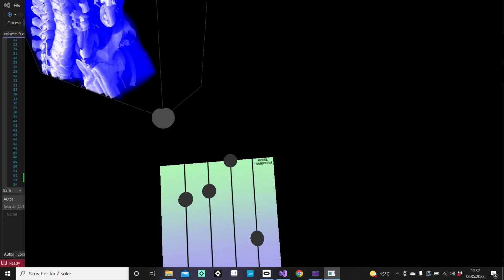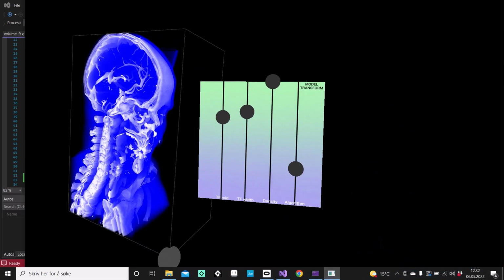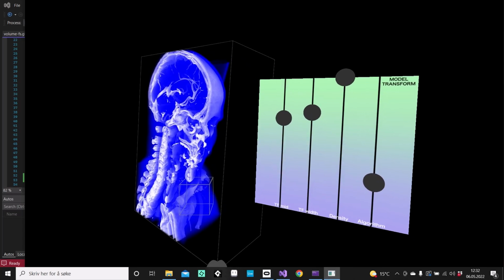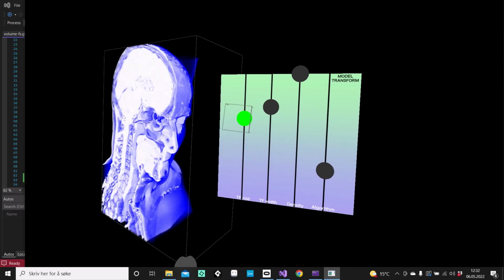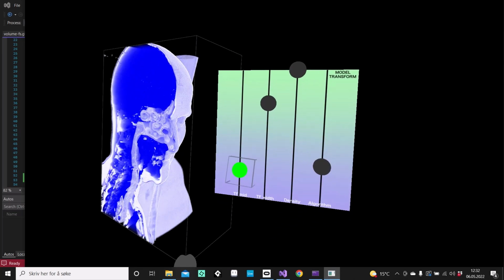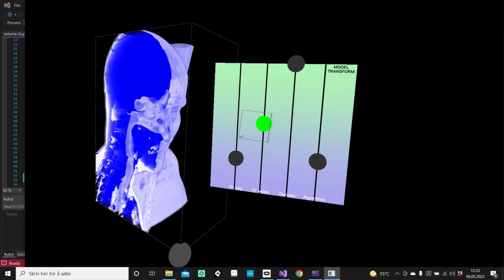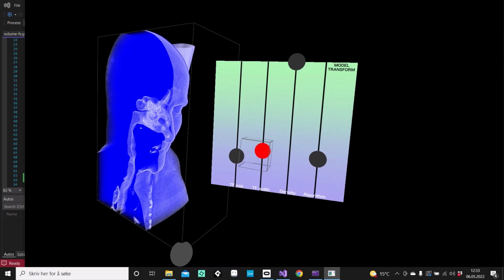Complex user interface interaction can be a bit clunky in extended reality, so I wanted to make a super simplified transfer function that lets you quickly define your area of interest. It uses two sliders. The first slider, called mid, lets you define a value as the perfectly opaque center value, and a second slider, called width, lets you define the width of the area of data values considered to be of interest.